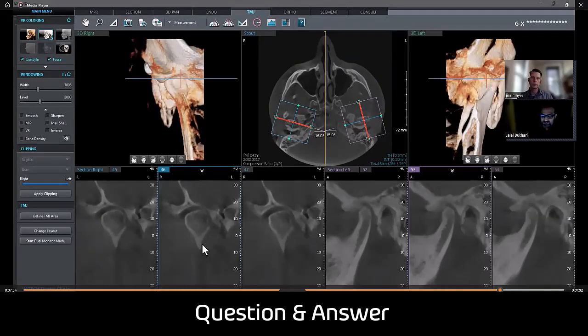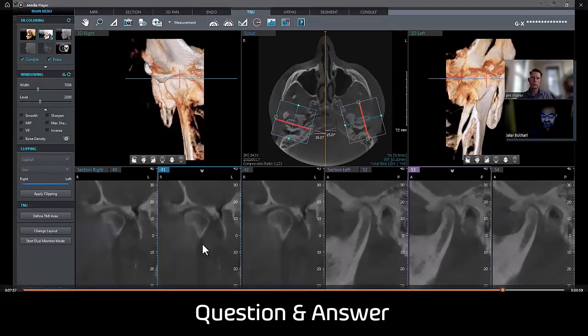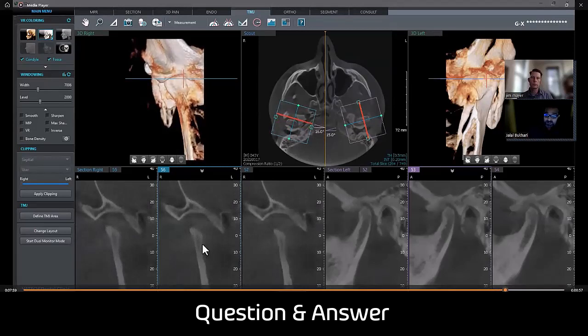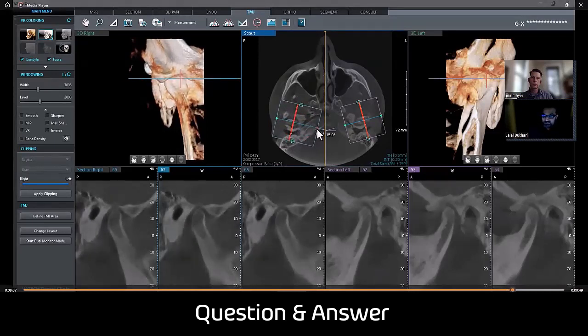Now, I mentioned earlier as well that with CBCT imaging, we have poor soft tissue contrast, right? So we can't really know the exact relationship of the articular discs, right? But having an idea of where the condyle sits in those 3 dimensions can give you an idea that, okay, you know what? This condyle seems to be slightly positioned more medial relative to the center. So that medial joint space region is slightly narrow. There's a possibility that the disc could be displaced, or the disc might be being compressed by the condylar head.